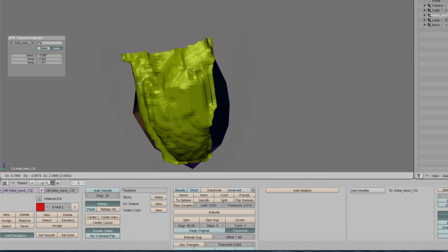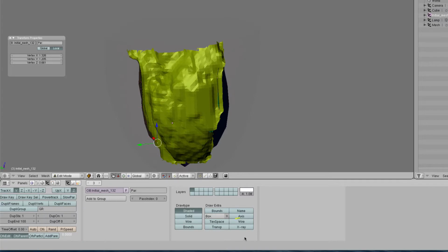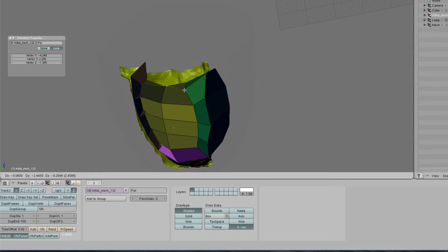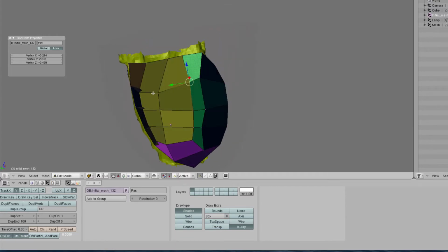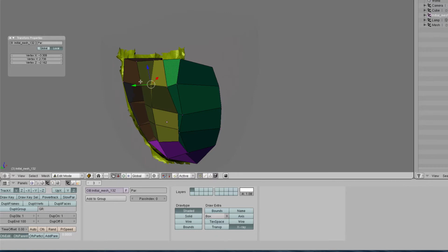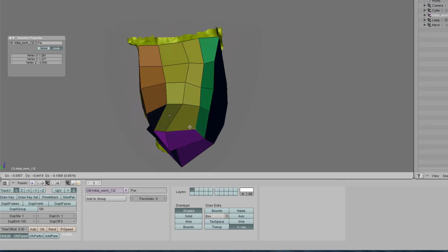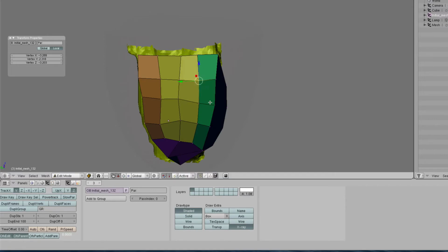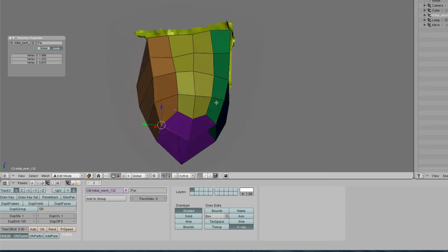One helpful tool is to, on the mesh, unclick Transparent and click X-ray, which allows you to see the mesh through the data. Throughout this entire fitting process, you will want to ensure that you keep all of the elements close to being cubic, and that faces don't intersect. It's also useful to be normal to the side that you are manipulating. When you're done with this side of the septum, work on the other side.